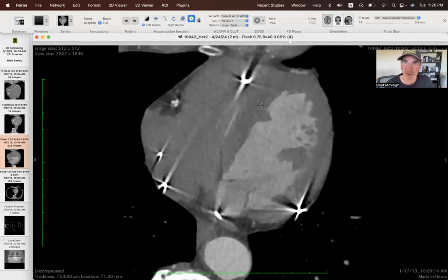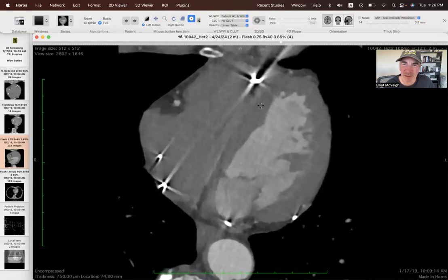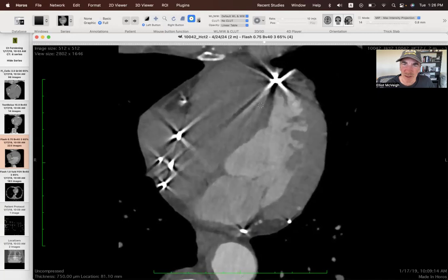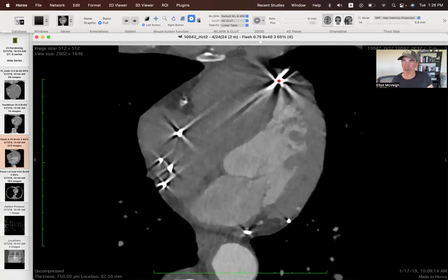Now let's go. We had a problem with these right leads. Let's see, did it drop any on there? Well, it said it wasn't. Yeah, there's one there. 1, 2. Oh, I dropped 2 of them on there. Okay, so it was dropping them. It just didn't have the classic graphic.